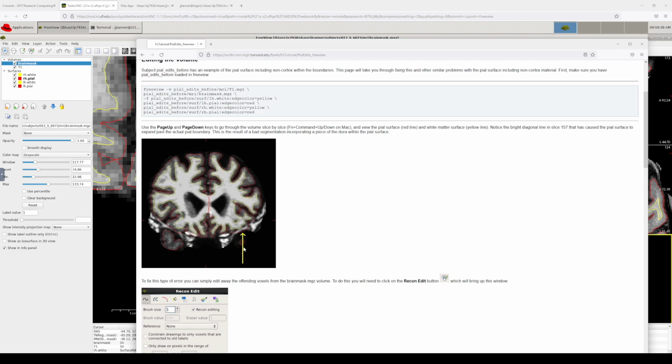And so generally what I do is process brains, and then I do a quick scroll through of them. And if it's just a few areas with a little bit of error like that, then I generally don't touch it. If I had a really limited sample size, then I'd go through each one, 5, 10, maybe 20 brains.